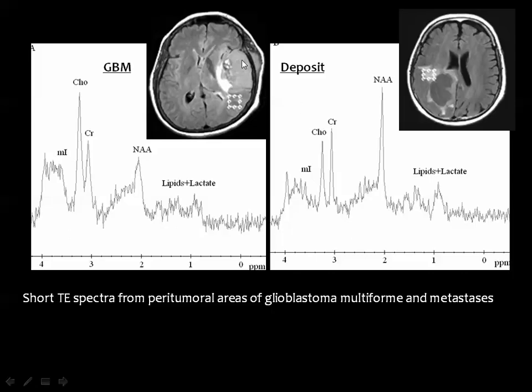The edge of the tumor is diffusing through the brain parenchyma, and we all know that this is not the actual margin of the tumor, it is beyond the margin that we can see on imaging.